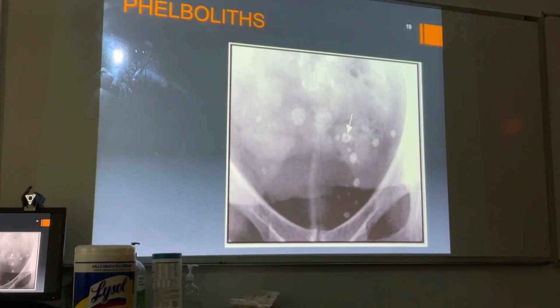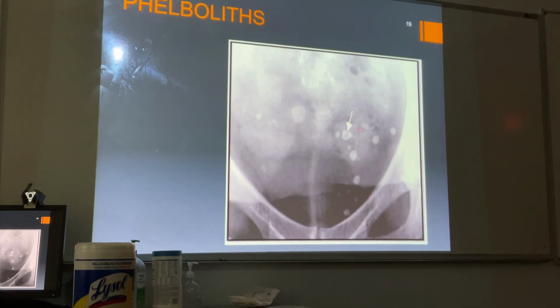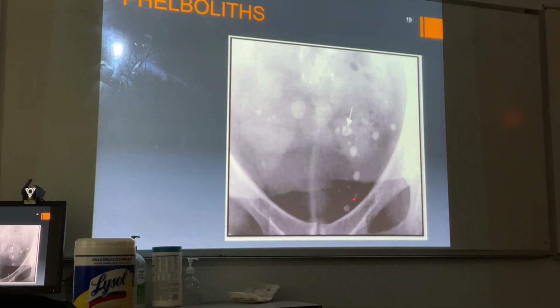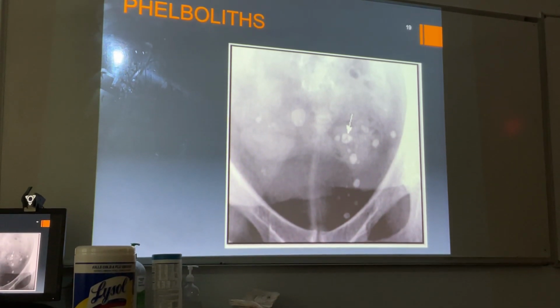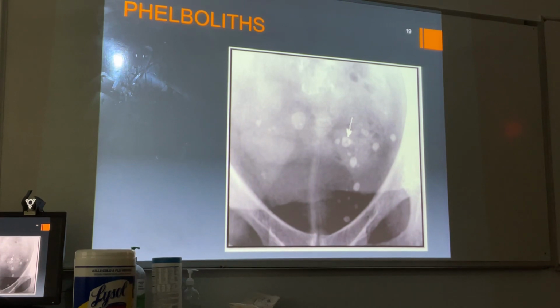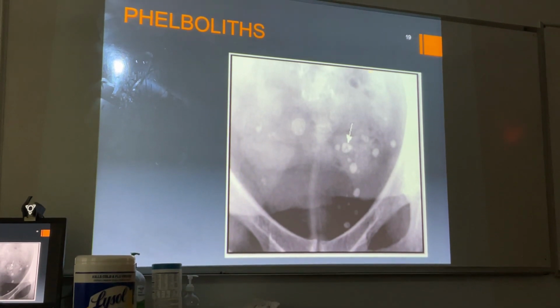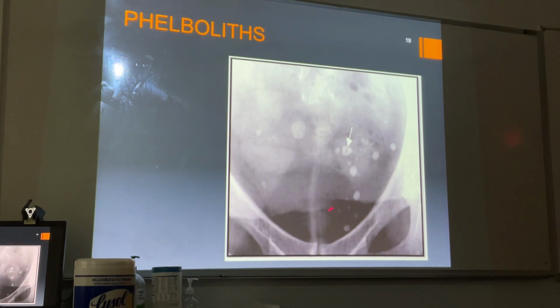You get these little calcifications as we get older, everything sags, so calcifications within pelvic veins. They usually follow the anatomic rim, small, medium, and large. You look at it and say this patient must have a tumor of the soft tissues. No, they're just varicose veins in the anatomic pelvic veins, and these happen to get infiltrated with calcium, and that's why they look the way they do.